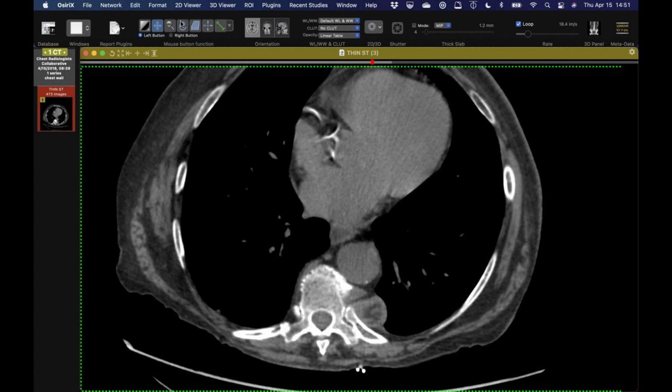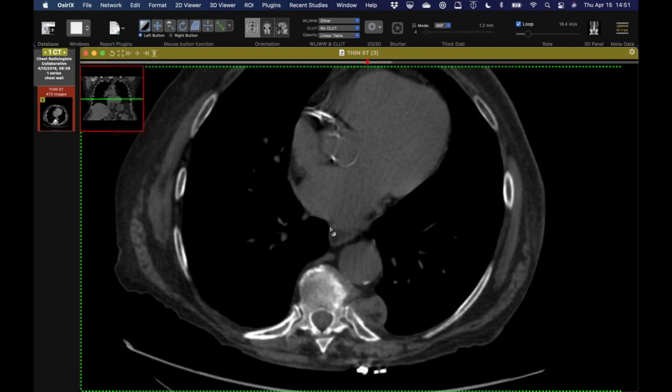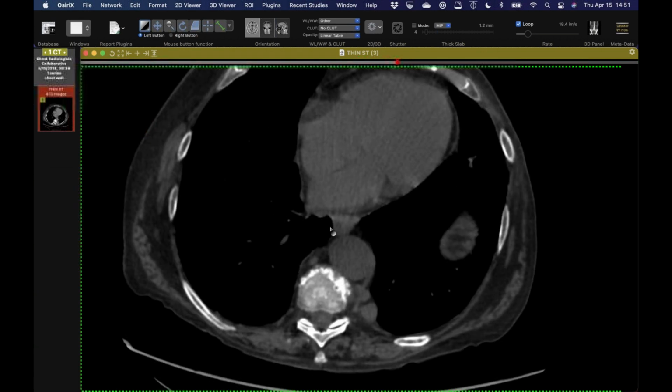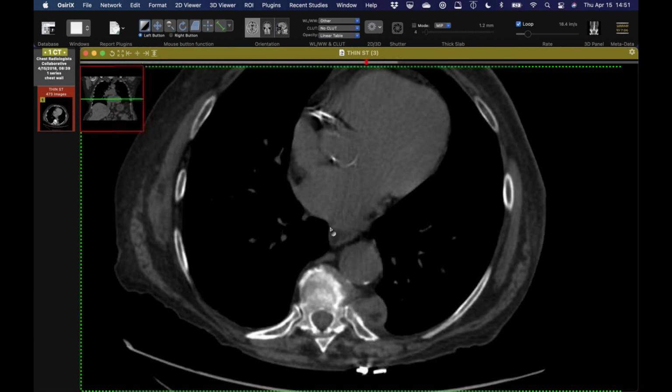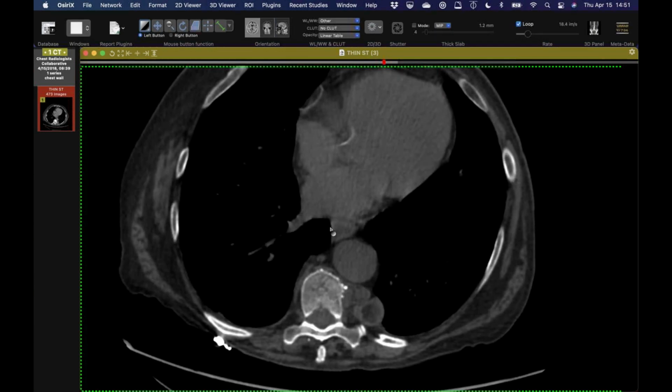So this is really cool. I've never seen one of these before. We had this just the other day, an incidental finding in a patient, and I honestly don't remember his history. I think he was a cancer follow-up with no metastases. But I noticed this mass here in the paraspinal region on the left, and it had been there, and eventually it turned out that we actually biopsied it at some point.